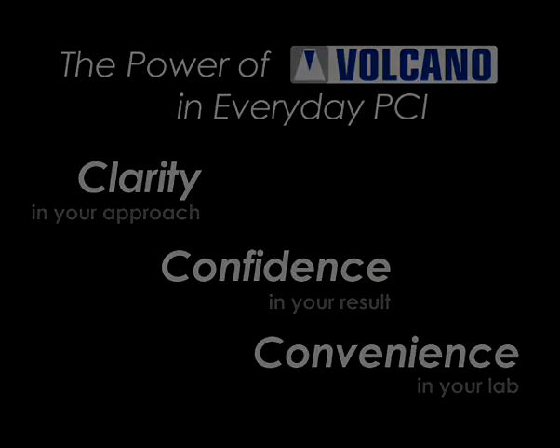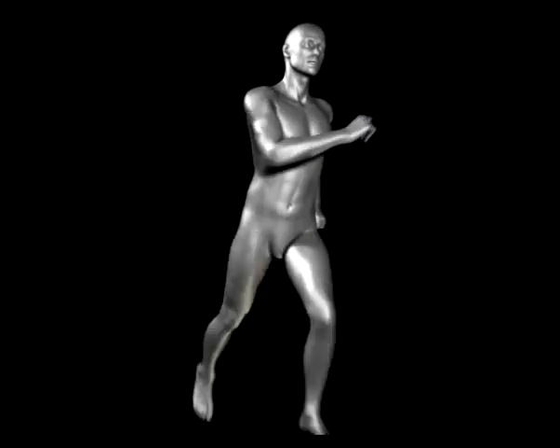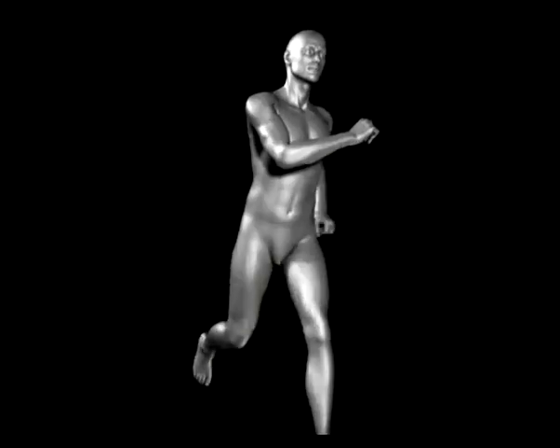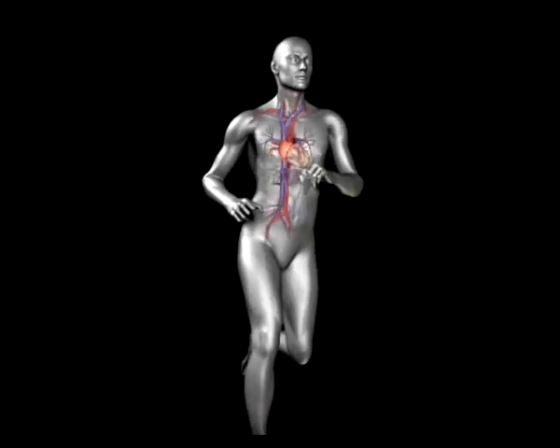When diagnosing complex cardiovascular disease, it is important to understand both the progression of atherosclerosis as well as the limitations of 2D imaging modalities. Volcano IVUS is designed to provide added clarity to the overall disease state and define a more complete diagnosis of each individual patient.